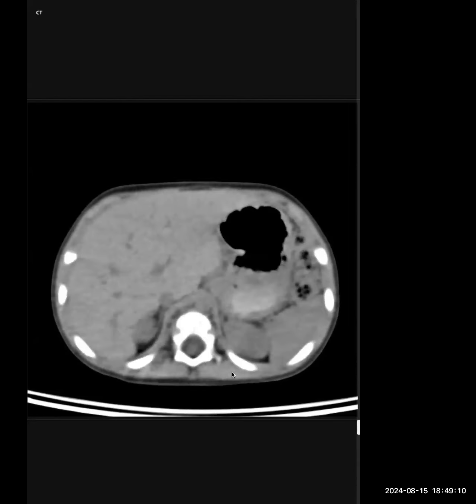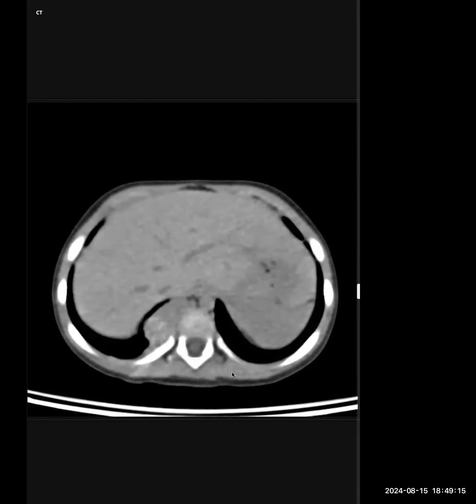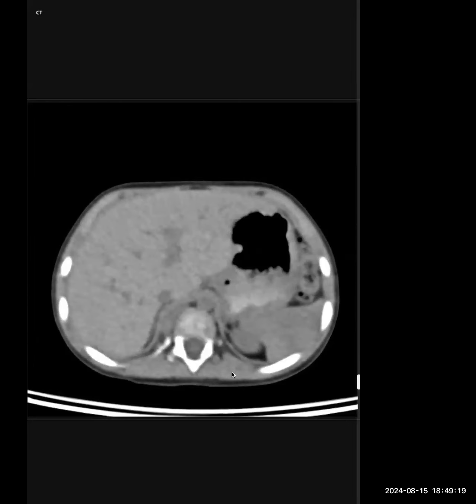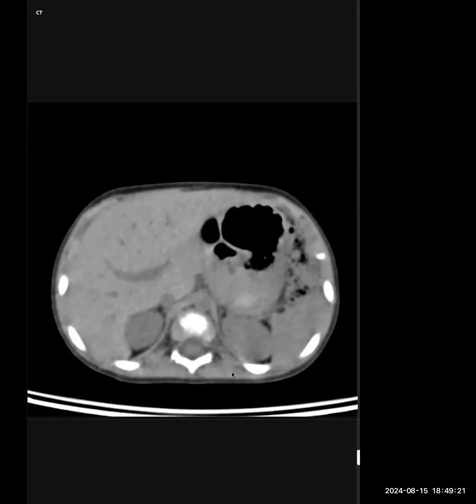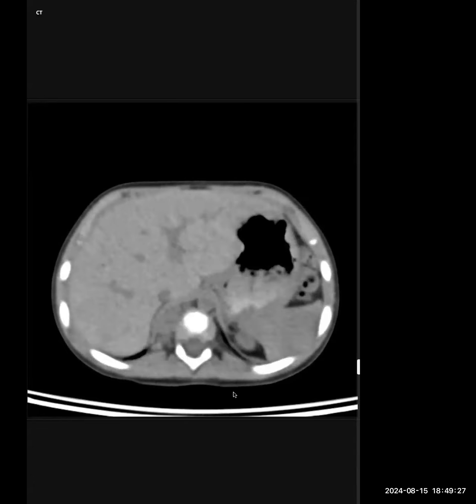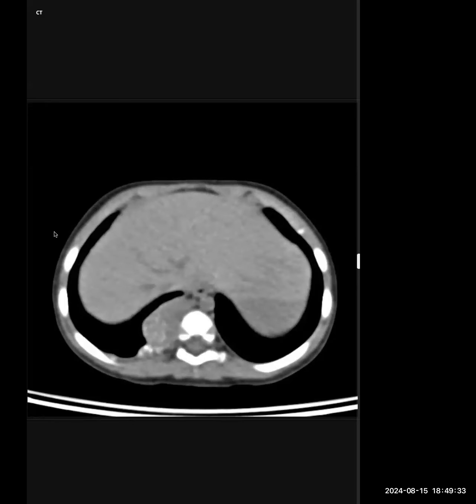The bilateral adrenals are normal, and for the lung metastasis, I would like to evaluate on the contrast enhanced scans, but on these non-contrast images, I cannot see any obvious focal lesion. Which plane in contrast enhanced would you prefer, axial, coronal, or sagittal? 5 minutes remaining. Coronal. Just coronal. Let go of the mouse and I'll give you what you want.